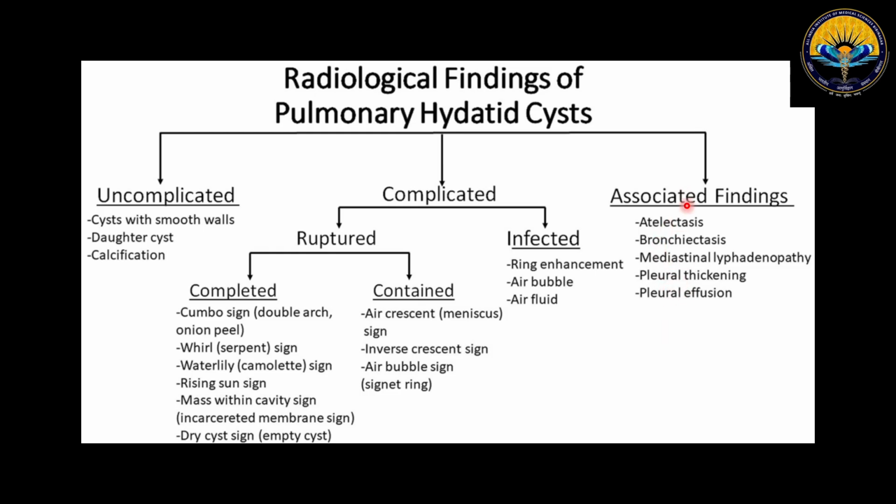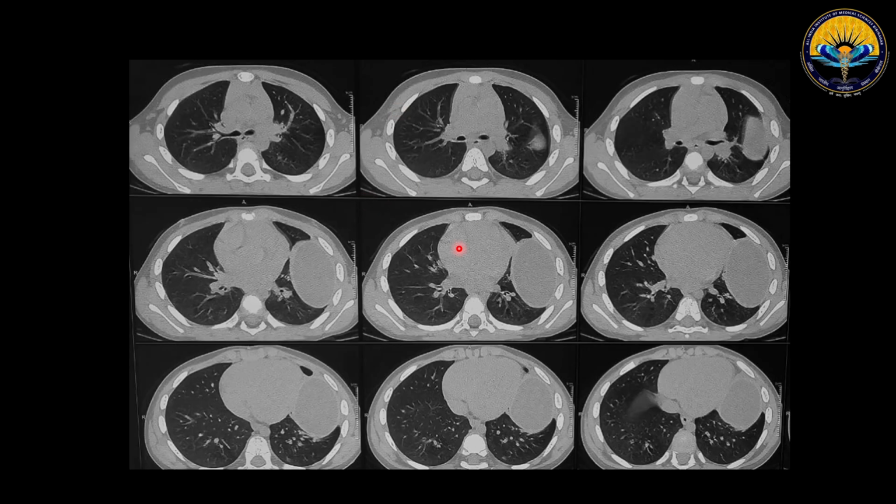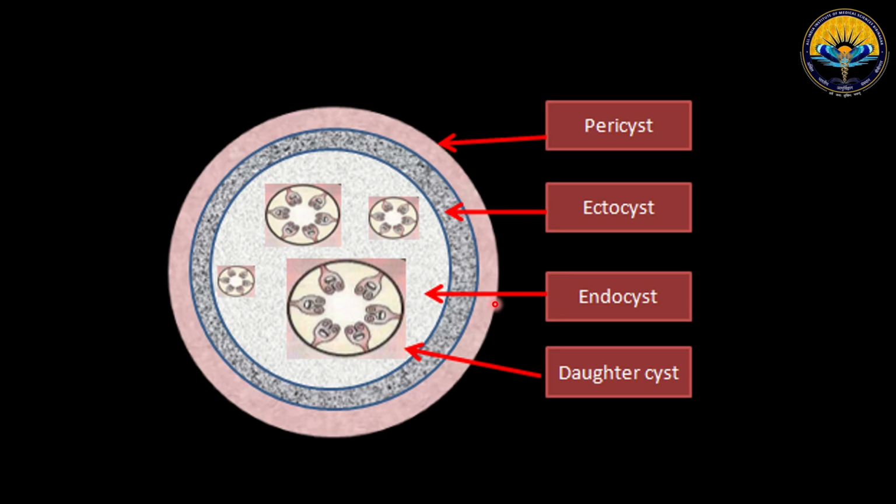We are not able to see any of these features in our case because the surrounding lung parenchyma and everything else appear normal.